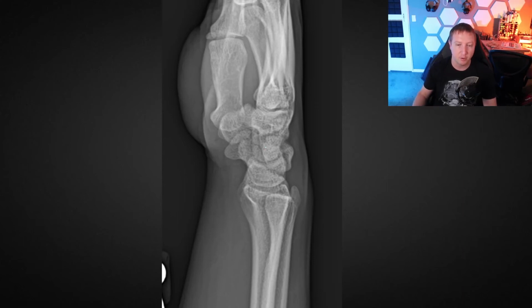All right, so those are the bones of the proximal carpal row. The pisiform, which we can see up here as well. And this is actually partly how we determine how well positioned the lateral is. The anterior cortex of the pisiform here should be about halfway between the capitate and the scaphoid. So a scaphoid here in purple, the capitate anterior surface here in yellow. So the pisiform, let me just trace that out a bit better here. You want it right in the middle there. And this is, you know, a perfect lateral if that's our metric.